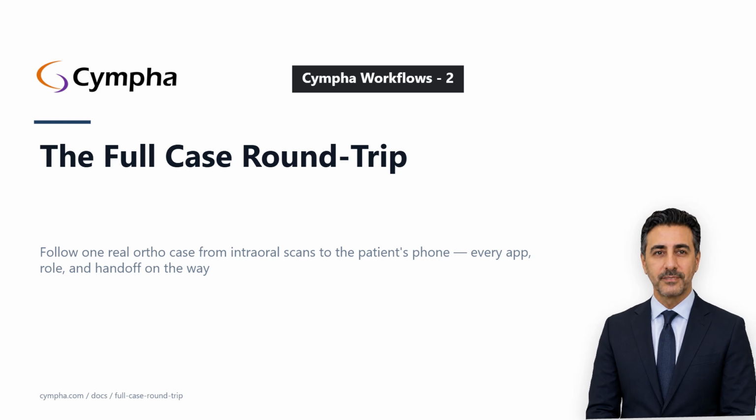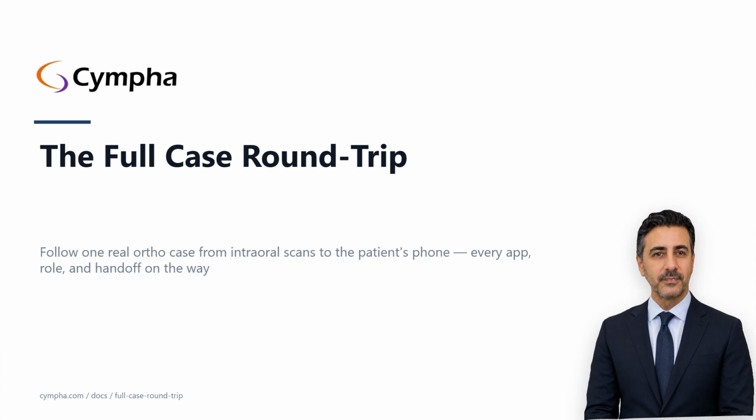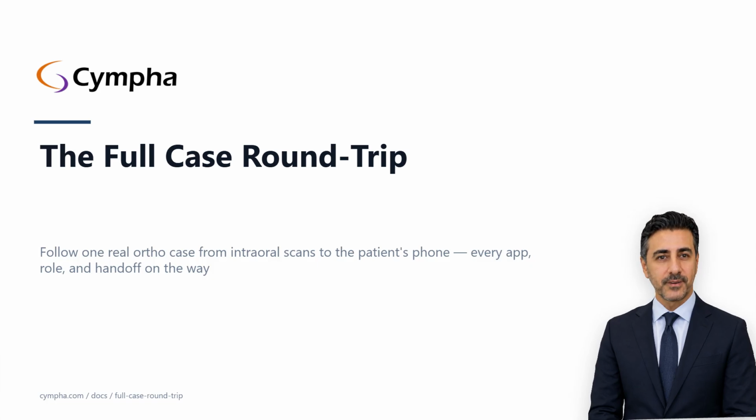Welcome to Guide Mia. Today we're going to talk about the full case round trip on Cympha, one real ortho case traveling from intraoral scans all the way to a patient opening their finished treatment plan on a phone. This lecture is for anyone who wants to see the whole pipeline at once, a clinician onboarding their first lab, a lab manager auditing their handoffs, or a designer who's only ever seen the middle of the workflow.